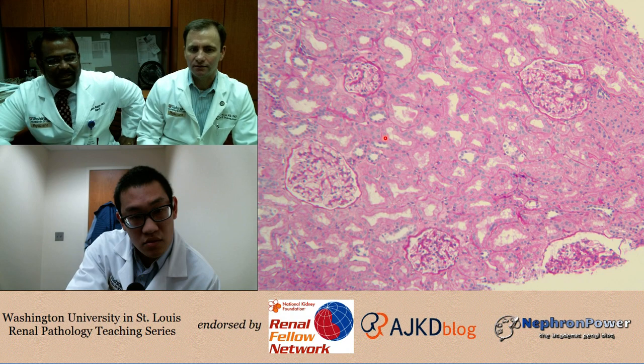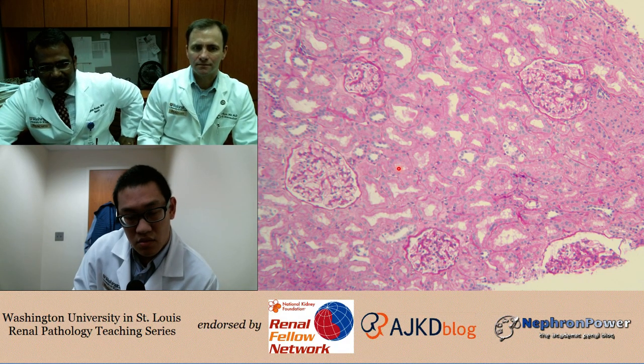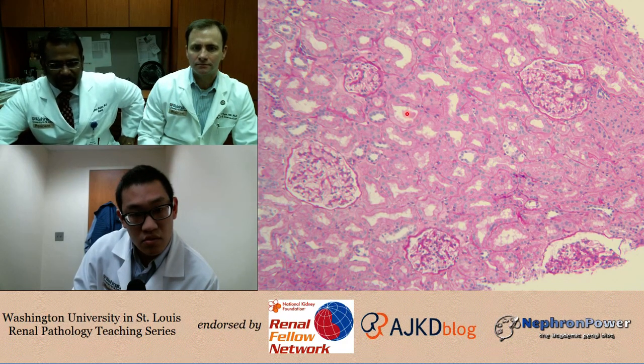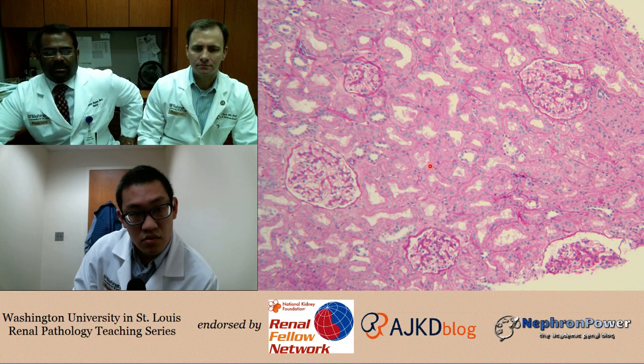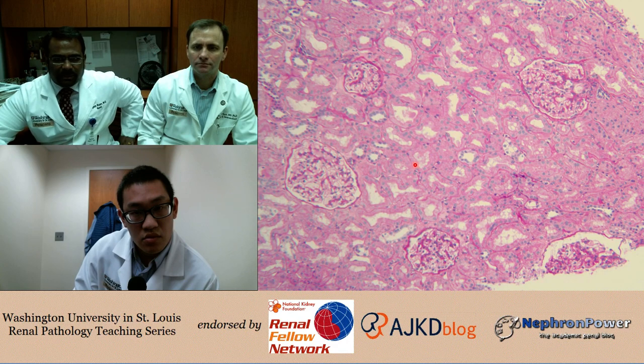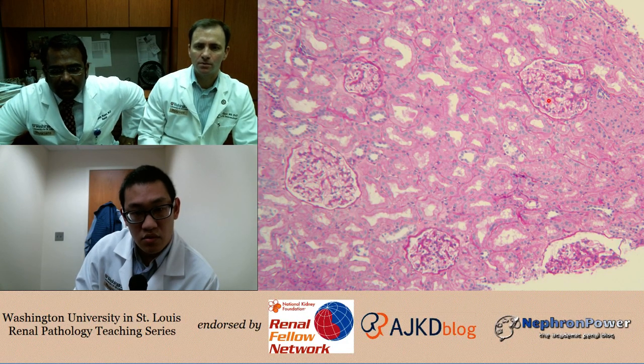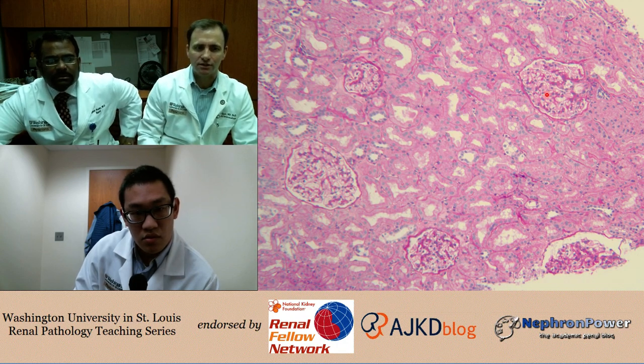That's fine, go ahead. So looking at the PAS stain, first of all, just looking at the interstitium and tubules. The tubules are back-to-back open, not so much debris. Maybe there's a little bit of debris right where you're pointing there, could be. I don't think it's proximal tubule. But other than that, looks relatively okay. I'm going to look at the glomerulus, and I don't see any significant sclerosis.